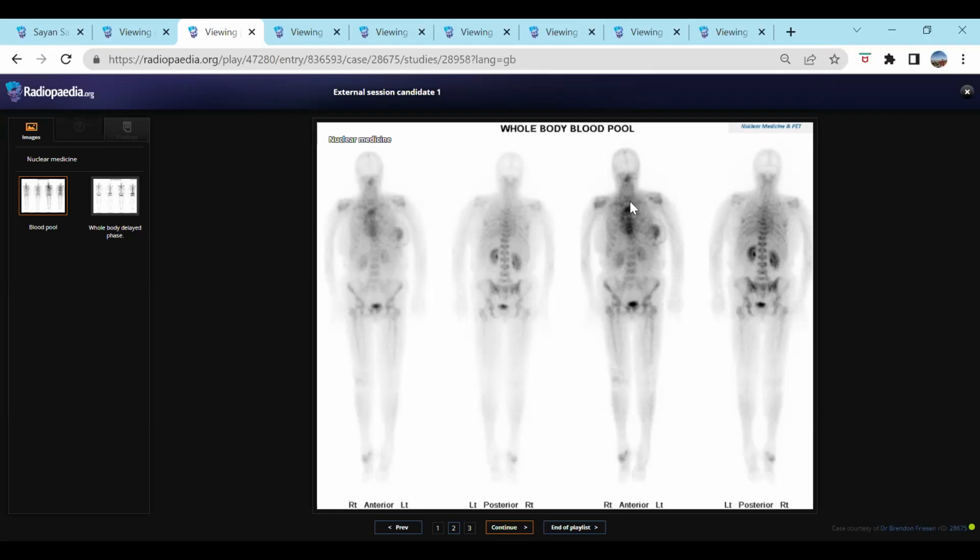Bones, yes. Scapula, bilateral symmetrical uptake, and there's also faint uptake in the sternum, right? Yes, and the costochondral junctions on the right side. That's fine. What I'm trying to say is, suppose it was an infective or an inflammatory condition, can you explain the sternal uptake?